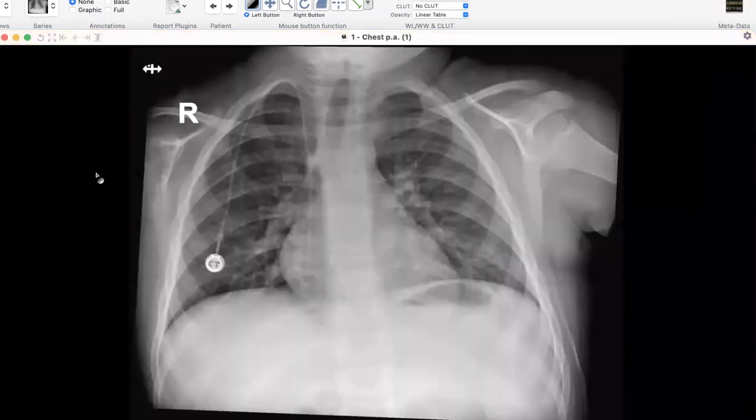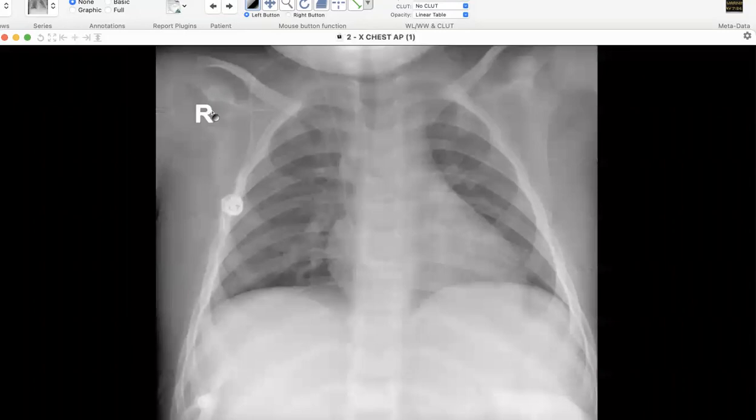Actually, I thought you would focus more on this lesion because this is the main pathology over here. You can see the glenoid margins are almost completely lost, and there appears to be an expansile lesion. I think this was missed, and it was caught on follow-up. I'm saying in our routine practice, it was just a screening film. It was missed.